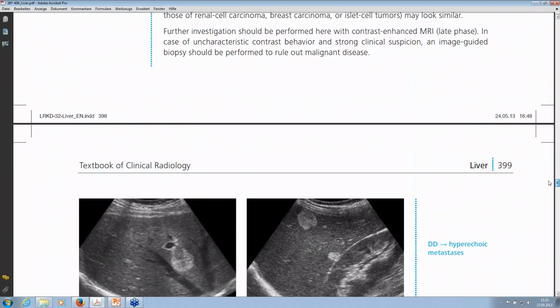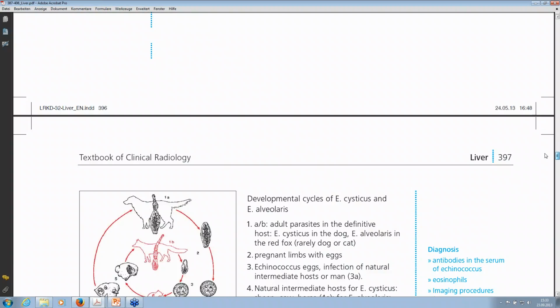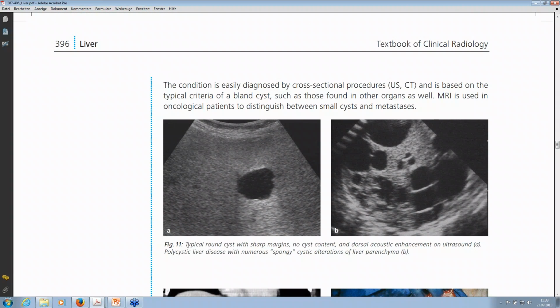This is a good comment, so that everyone has the opportunity to keep in mind what a sharp lesion is. The cyst in the left image is a classical anechoic sharp lesion. We have two questions left concerning all the images we saw. The first one is: is there a general rule for when a metastasis is hypo- or hyperechoic?